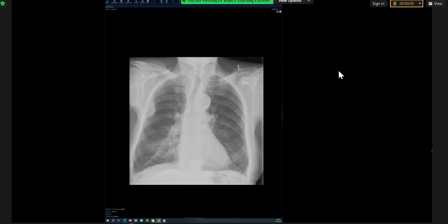On this last case, why could this not be a pleural met with rib destruction? It absolutely can be, absolutely. And if I was the candidate, I would have said pleural met with rib destruction or a bone met, vice versa. It definitely can be. You cannot differentiate purely on X-ray. But the take-home message should be that if you see that on a chest X-ray, you have to pick the bone destruction and you have to call it cancer. You have to escalate appropriately, considering the patient likely has cancer, either primary or metastatic. So it doesn't matter whether you call it pleural or bone. You can't differentiate on X-ray.